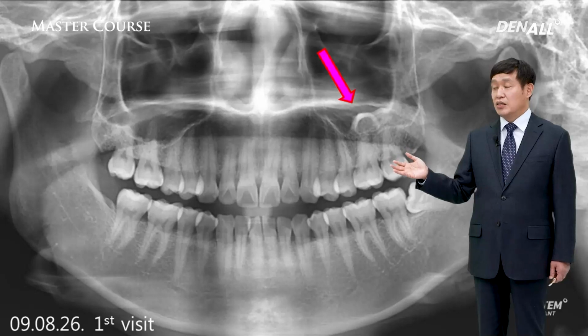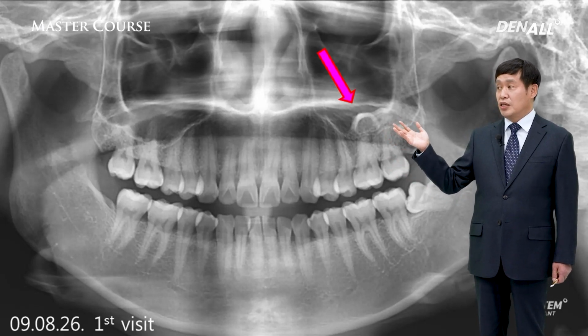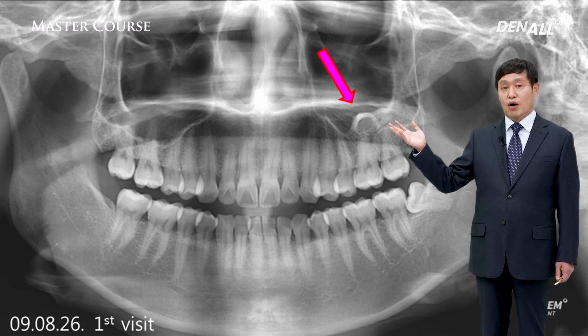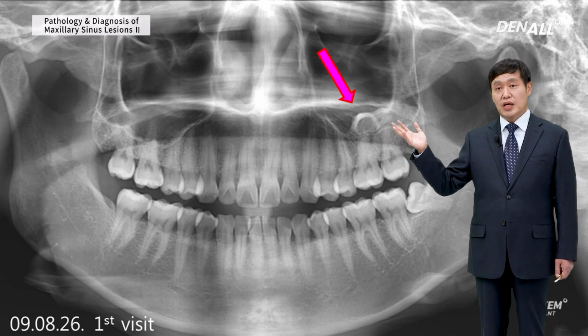This is panoramic X-ray. The patient was referred to me from a private dental clinic. Within the sinus, there was increased radiopacity and the shape looks irregular. The dentist didn't know what this was and referred the patient to me.